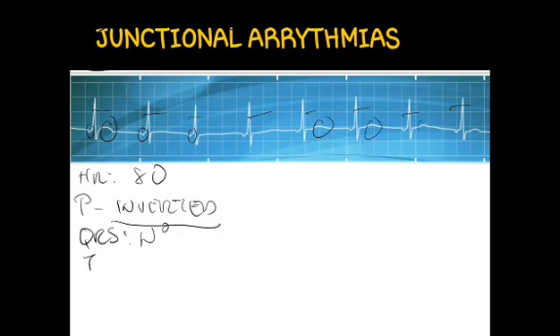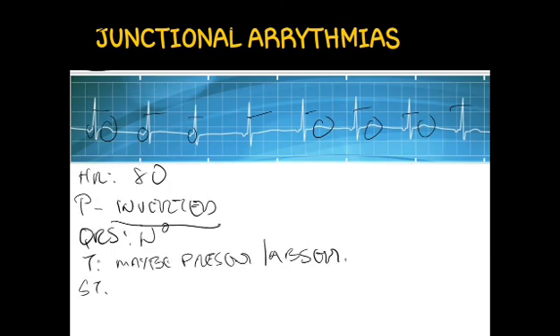There are T waves, but there are rhythms that have no T waves. Okay, so T wave may be present or absent in some rhythms. Okay, so how about your ST segment? Your ST segment, still it is not depressed, it's the same. Okay, so no problem with your ST segment.